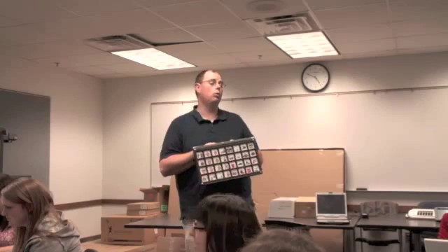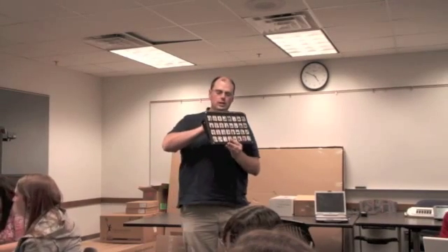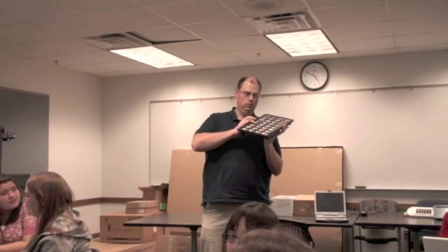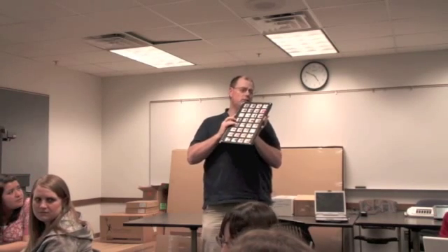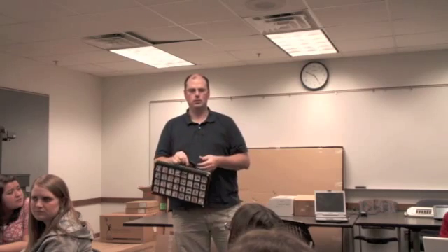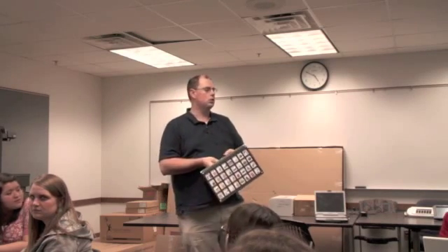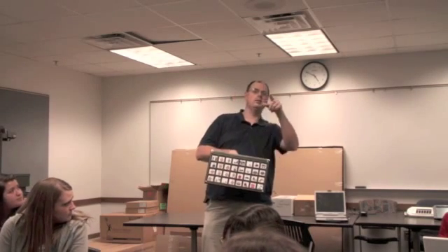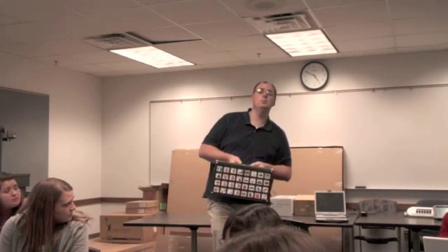Now, what does this require? And again, it's easy to record it. It's easy to update the vocabulary. I feel so lazy. So as you consider not just the student, but the support services, that's something to consider. Yes, it's called a 32-message communicator.